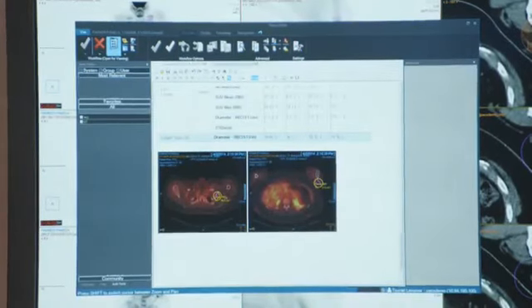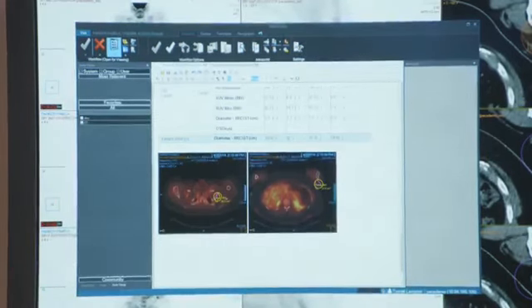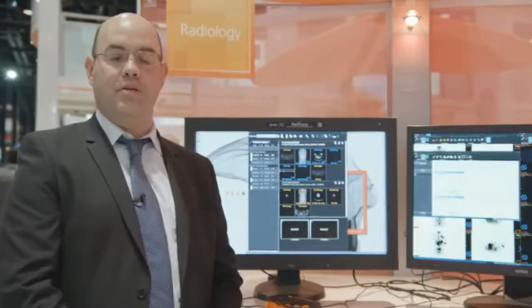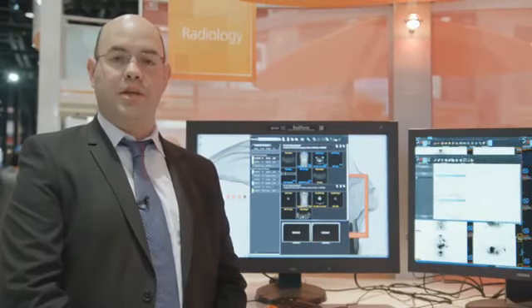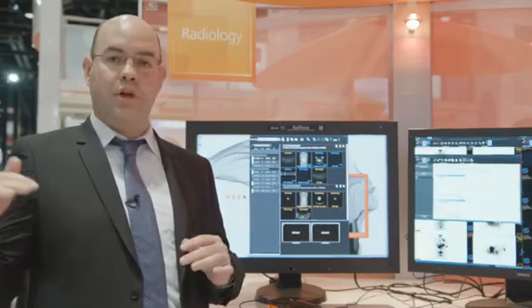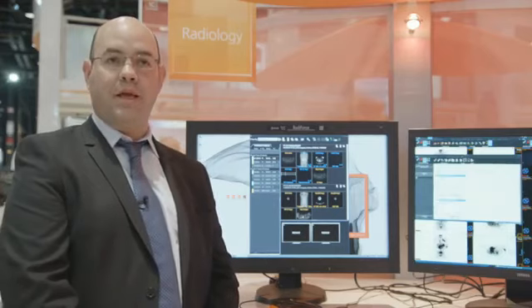So this is basically the workflow for an oncology reading. We have to segment and detect new lesions, we have to track lesions that we already saw, and we go directly to the report from there. So what we did is that we used a PET-CT, which is the home of oncology reading. We did some segmentation using the new threshold segmentation tool in order to segment lesions over the PET imaging, and we used it in order to track the lesion over time and directly embed it into the report.